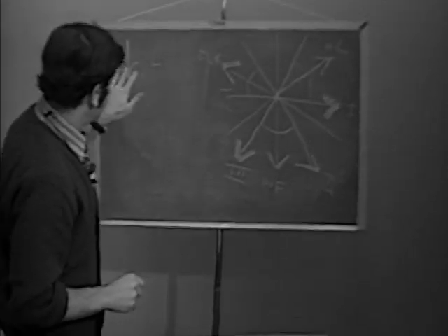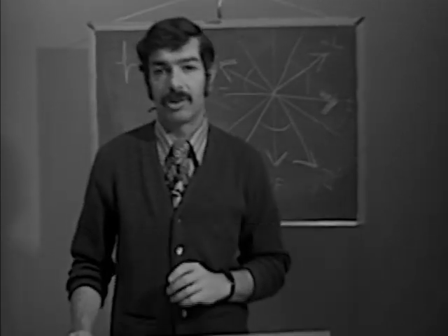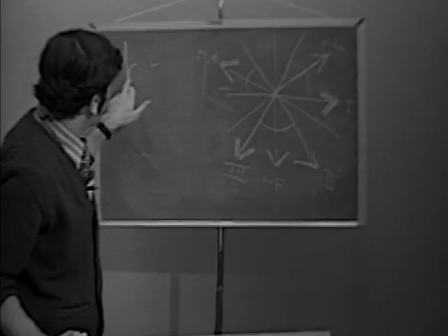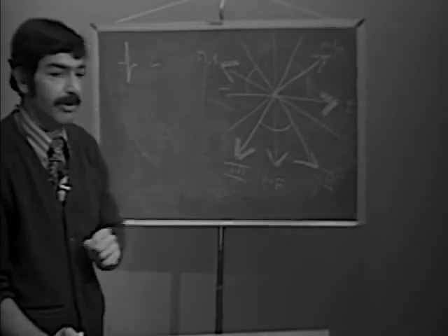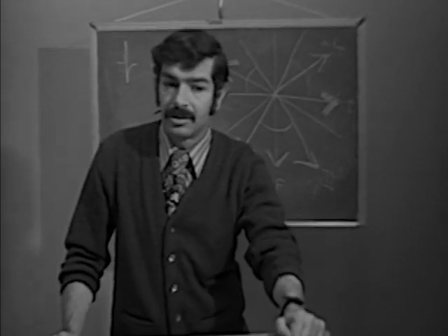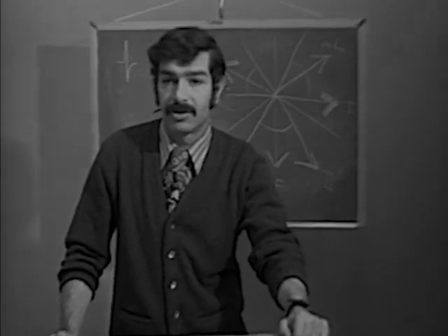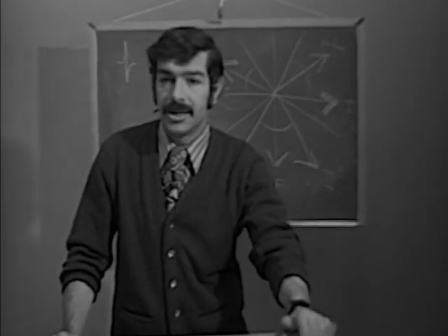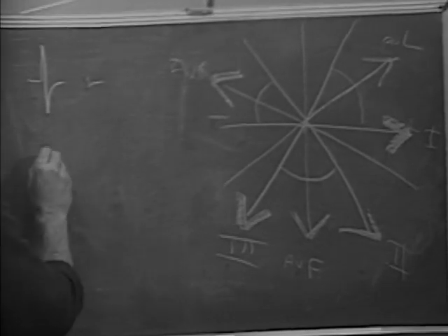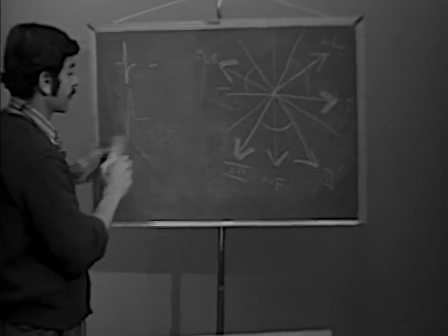And usually in every cardiogram, we can find one lead which comes the nearest to being isoelectric. We may not find a perfectly isoelectric lead. In some electrocardiograms, every lead looks like this. Every lead is isoelectric. And if you see something like that, your axis is what they call indeterminate. You can't determine the axis, obviously. So this is called an indeterminate axis. If every lead looks something like this, some might be negative and then positive, but they're all isoelectric, is the point.